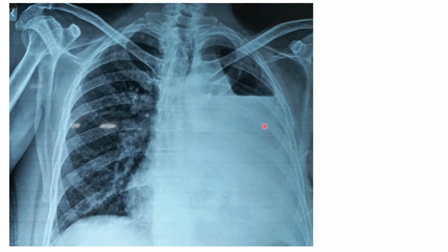So for hydropneumothorax, which means there is air and fluid in the pleural space, usually it starts from the medial aspect to the lateral aspect. And second thing is, for hydropneumothorax, this entire thing should be white because fluid is filling up the space. If it is white partially and here you are seeing lung, then it can't be a hydropneumothorax. We'll see an example for that as well.